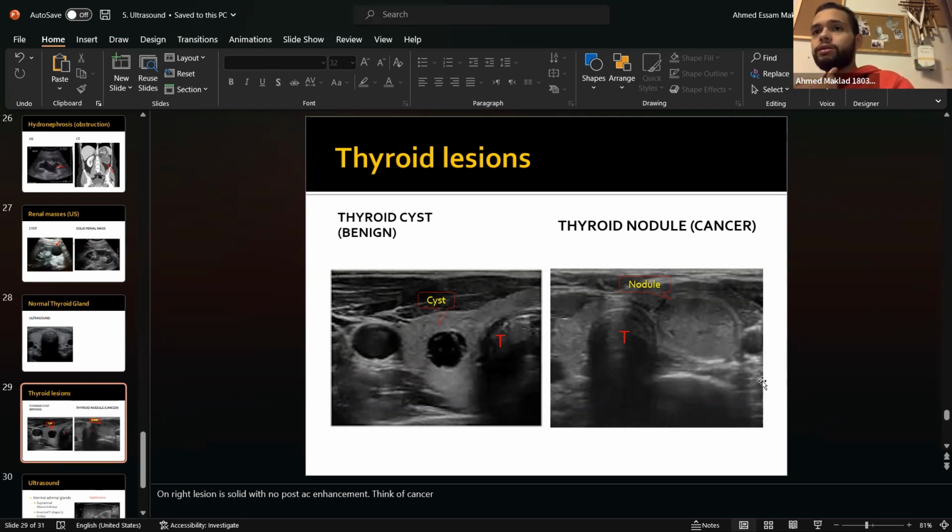If you compare this area right here, which is right behind this, and then you compare this area right here, there is no difference. And that's how you can tell there is no shadowing, and also there is no enhancement. Was this clear? Normal organs do look this way, exactly, right?